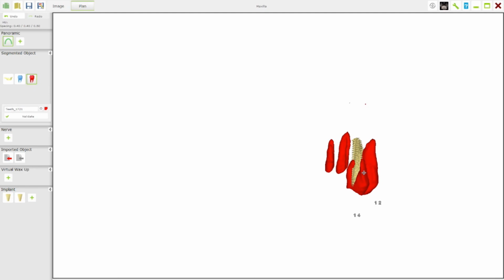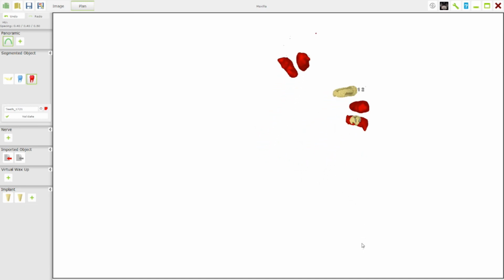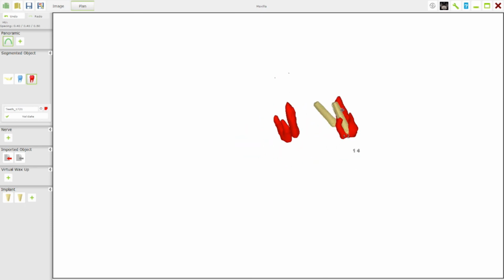the moment. When we extract, that red, if you like, will become a blood clot because there'll be no bone in that area, because this is where the roots are. We can see the nice little hook on the roots there, and you can examine the roots in relation to the implant. Again, if we were to be keeping that canine, we could certainly look at that in relation to other roots very nicely three-dimensionally, which is marvelous to be able to have.